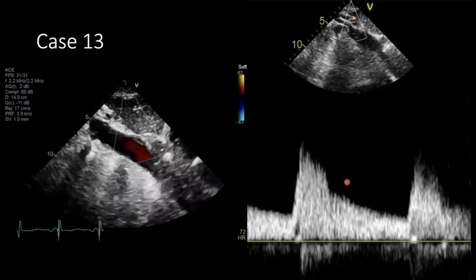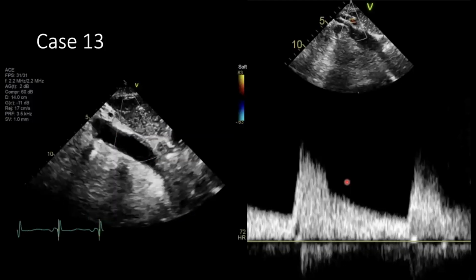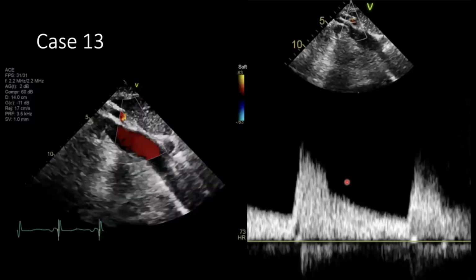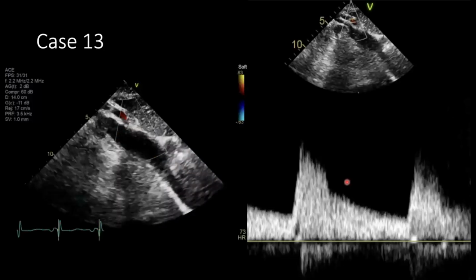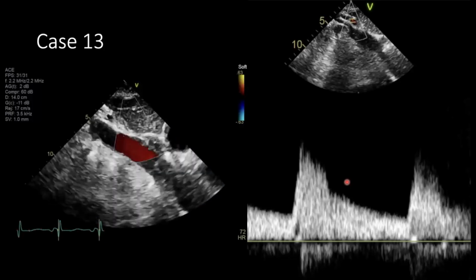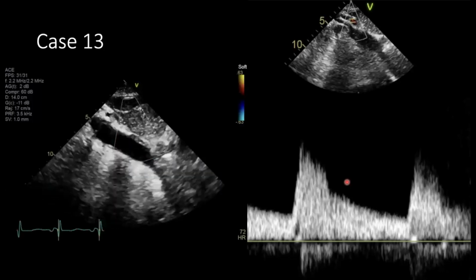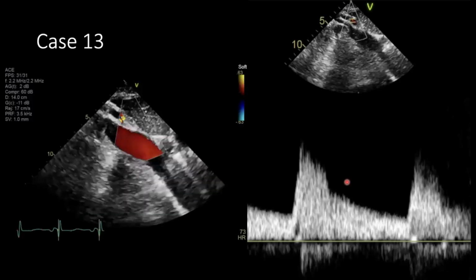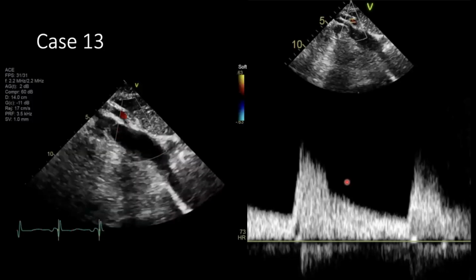But it did show the abdominal aorta, and you could see from the color Doppler that the color Doppler and the PW Doppler didn't match exactly, and there was red flow right there. So as a reader, if you don't have it, you should be able to suspect that it's an issue. The velocities weren't high enough, and those are all clues for why it couldn't really have been coarctation of the abdominal aorta. Which, by the way, has been described, coarctation of the abdominal aorta alone. I know it's generally more proximal, but I was looking it up while coming up with other options, and it does exist. So it's important to look at all the information.